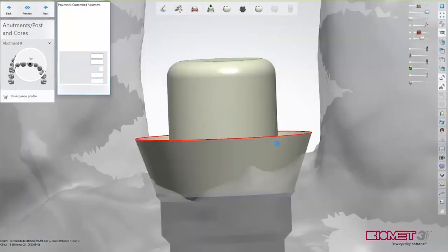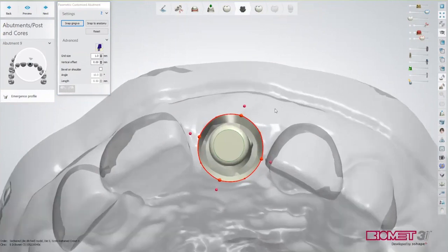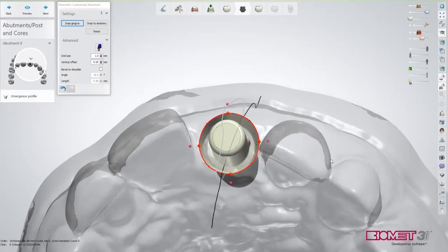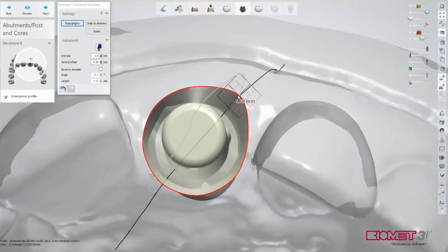And now we begin designing the gingival portion of our crown. First thing we do is to align our control points: buccal, lingual, mesial, and distal. And we want to begin the shape of our crown at the gingival, which, as we can see from the adjacent teeth, is triangular. Our central, triangular in shape. So we will simply start designing the gingival portion of our crown.